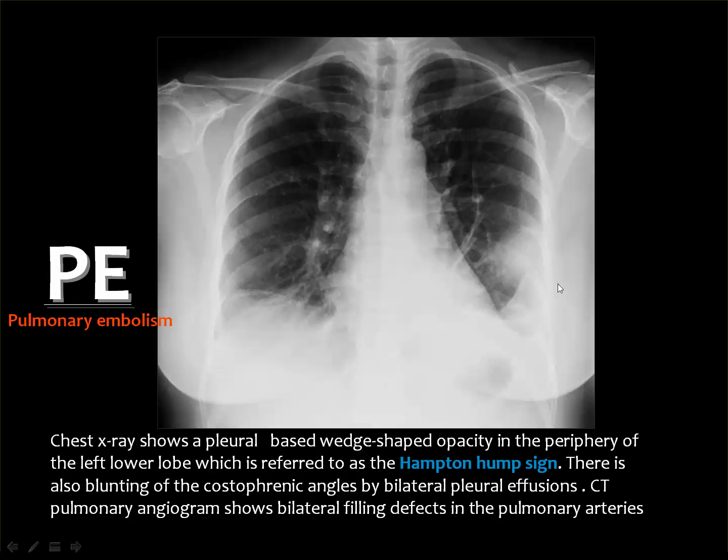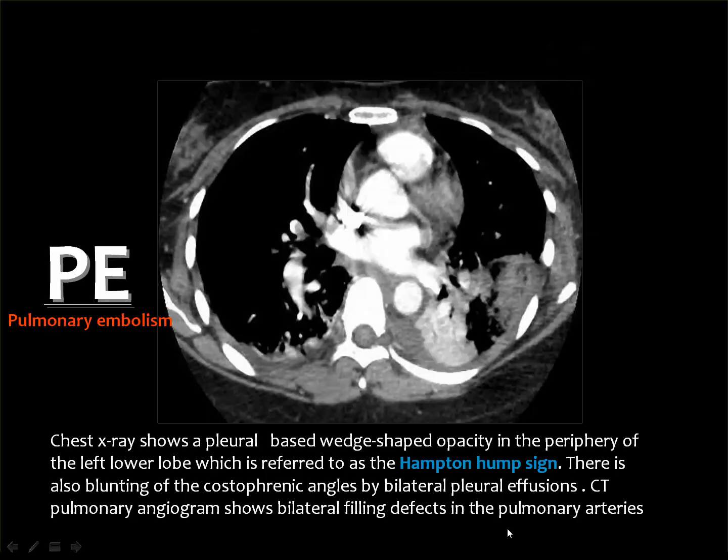And also here you can see this pulmonary opacity in the left lung base, and you can see the obliteration of the costophrenic angle by pleural effusion. We are not allowed as radiologists to diagnose this as an infarction unless we have adequate supportive clinical data and laboratory findings.